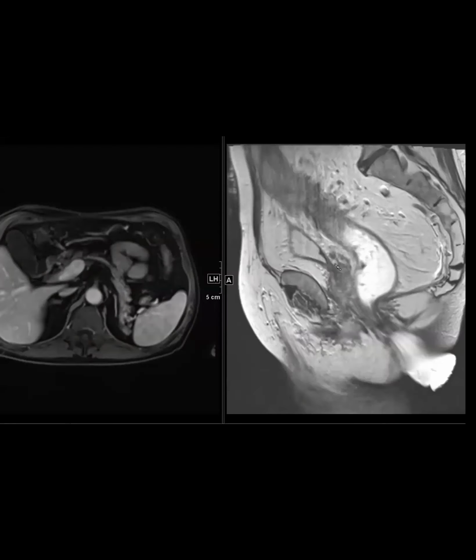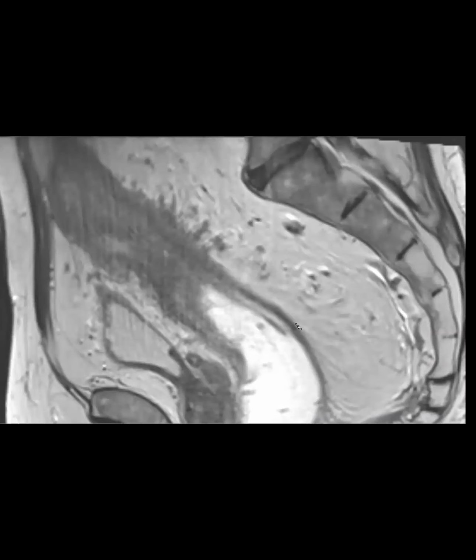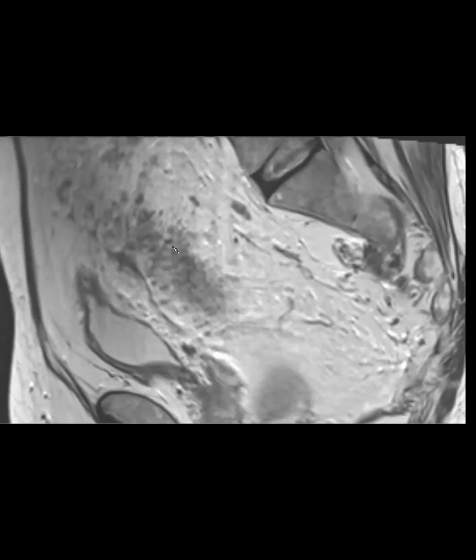Okay, and then I just have one more acute case. This is a patient that has a kind of extensive high rectosigmoid cancer here. That's not really the point of my case. You can see though that it's extending beyond the wall, so a very aggressive, long rectal cancer.